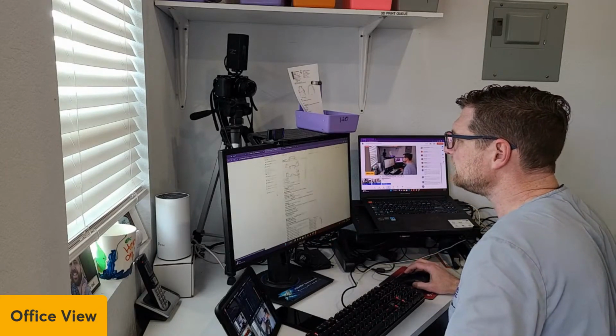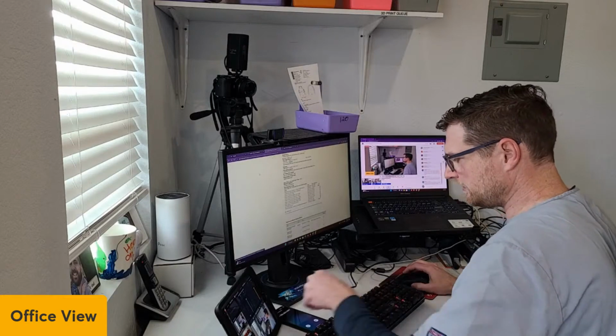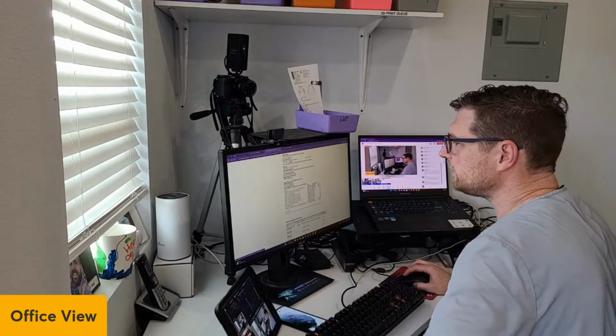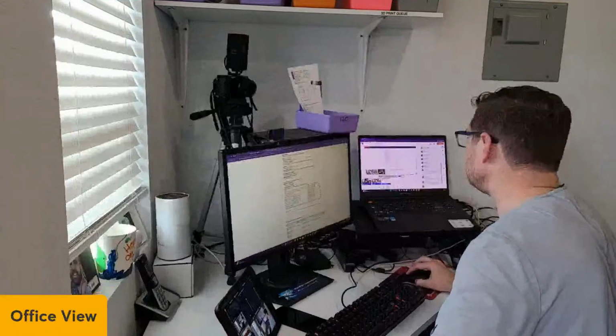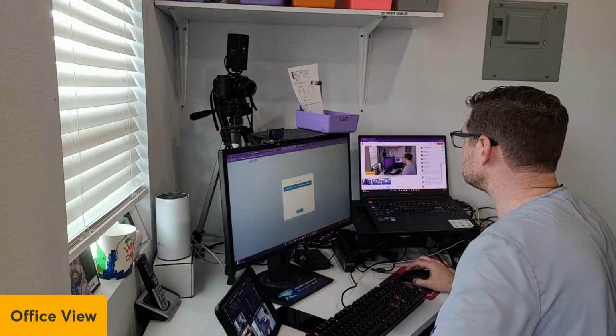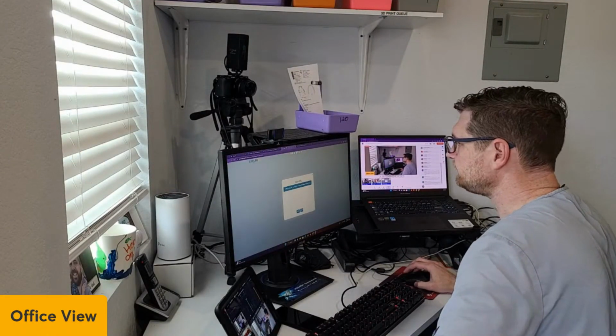I'm going to keep this up here, and let me show you my view here. Okay, so it's down here at the bottom, and it adds it. So once it finishes the auto basing, it sticks it in there. So we're going to preview this real quick, and I may change solo layout. So let's view this.